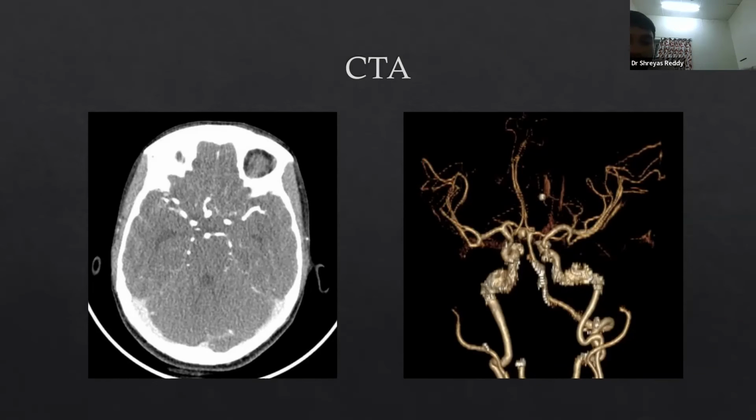Okay, fine. So now that we have seen the morphology of the aneurysm, what would you do next? Now, they can do clipping on a CT angio. What is the next step that you would do as an interventionist? We can do endovascular. No, to confirm this aneurysm, I would like to do digital subtraction angiography of the cerebral circulation. Usually a 4-vessel angiogram. Yes, 4-vessel.